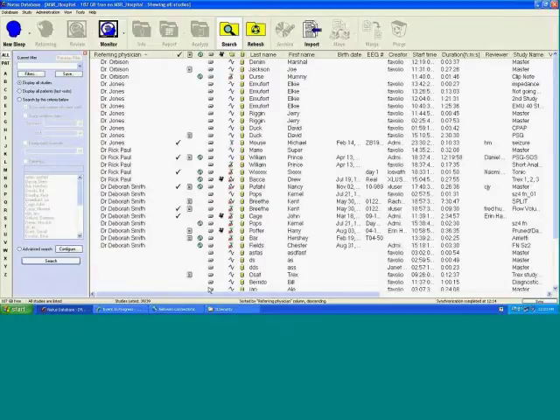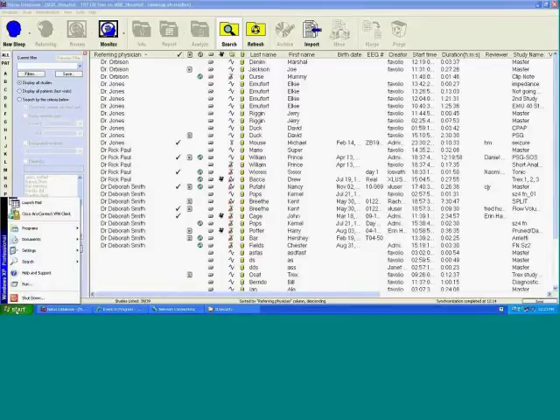Okay, so right now I'm just going to go to the Start button. I have XLSecurity enabled right now, so I do have some degree of security enabled. I'm not going to go into installing the security, how this gets installed, because this gets installed during the beginning.